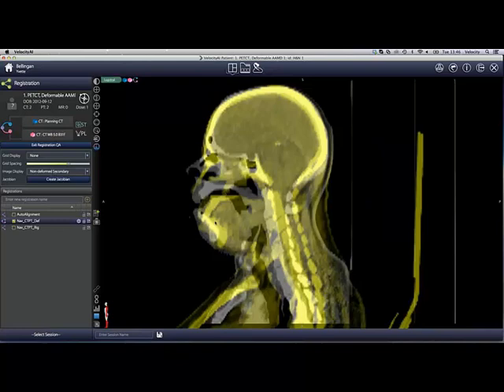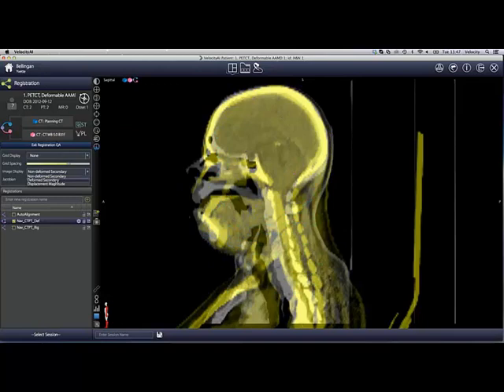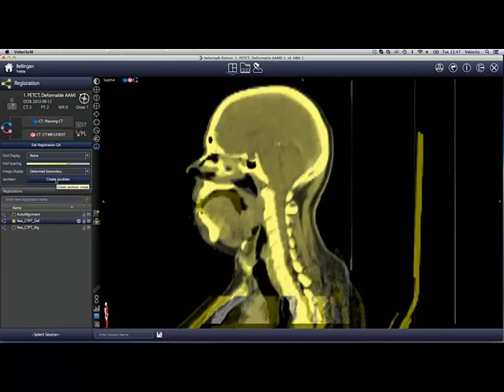Now, this patient had treatment in August of 2008, and he came back in December 2008 with a recurrence. And if we look at this, I'm just going to show you here in the view. The pink is the secondary image, so this was the original treatment plan, because we will want to deform that CT to the new treatment planning position. If we look at the new planning position, you can see this patient has shrunk quite a bit. This mass that we're seeing where my mouse cursor is has disappeared.